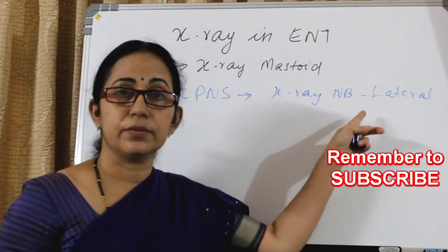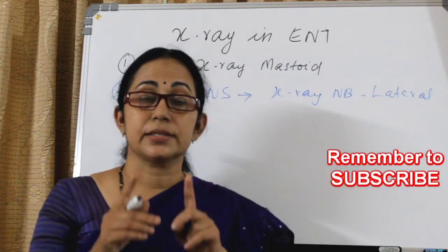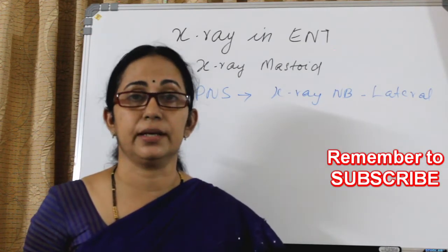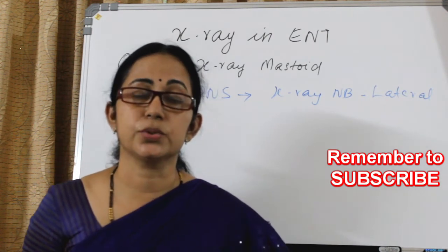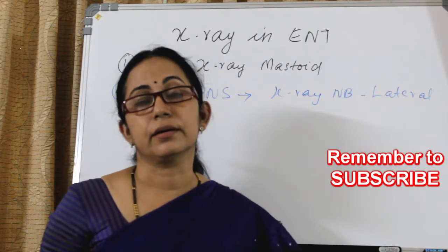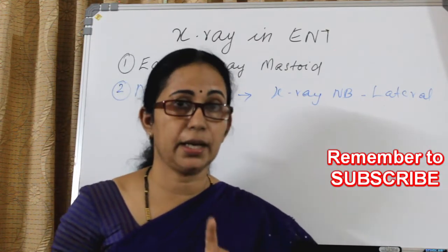And in this, one thing you have to remember, that I will show you in the X-ray, that there is a groove for ethmoid nerves and vessels, and that should not be mistaken for a fracture line. In exam it's a usual fault done by the students, that you will mistake the groove for ethmoid nerves and vessels, and an incorrect diagnosis of nasal bone fracture is made. So that should not be done. That I will show you in X-ray.